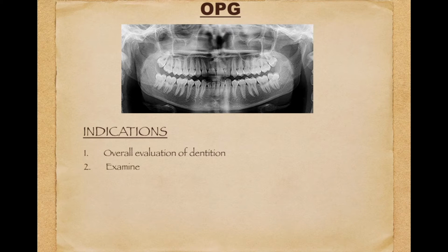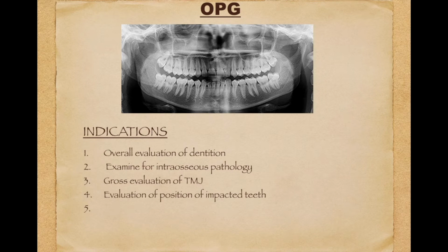We can examine gross intraosseous pathology like cyst, tumor, malignant lesions. It is also useful for gross examination of the TMJ. Even we can evaluate the position of impacted tooth, dental maxillofacial trauma and developmental disturbances.